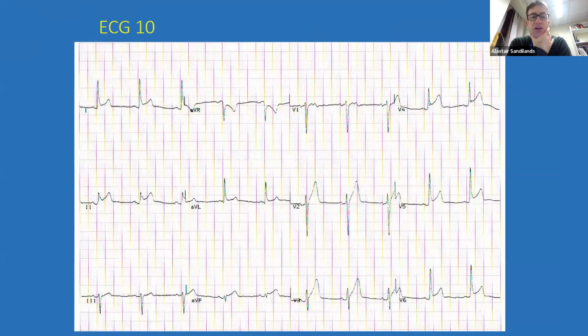Okay, so have a look at this ECG and see if you can make up a history from this ECG. It gives you a bit of a clue.